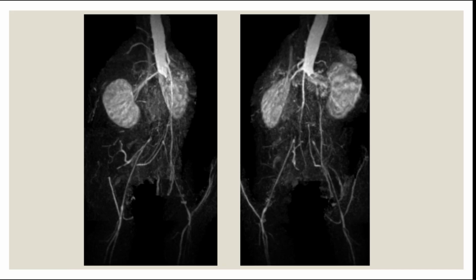I know you still didn't really go through all of these, but just tell me, since we are now seeing vessels, which part of the body is this? You don't really have to tell me the diagnosis. We'll leave diagnosis for later.